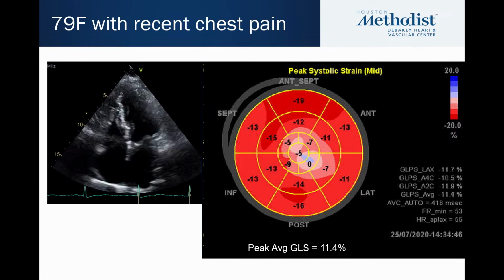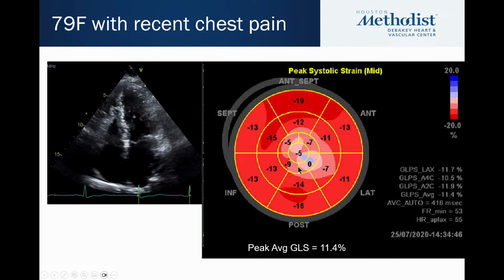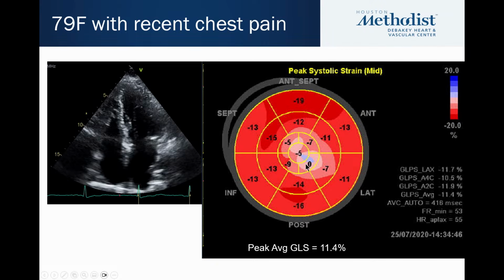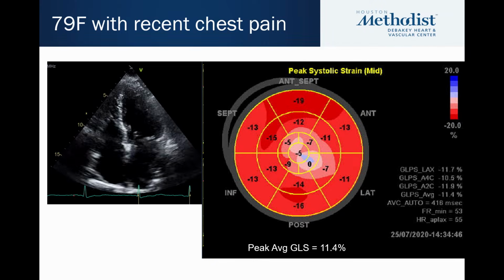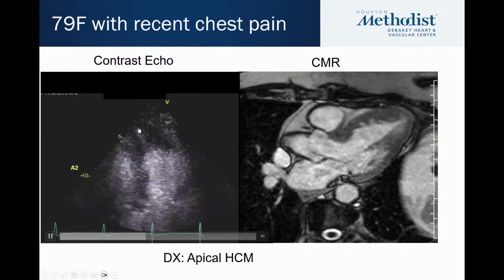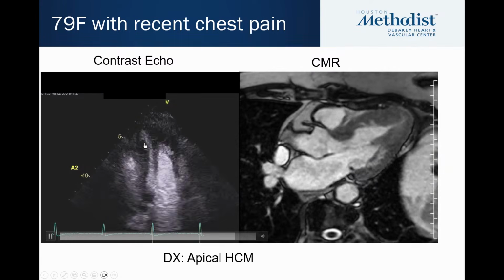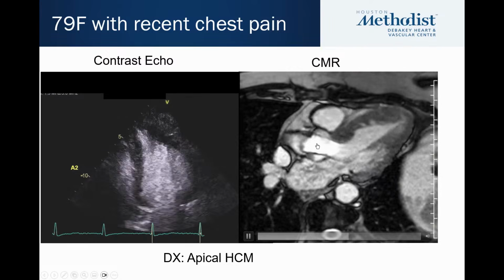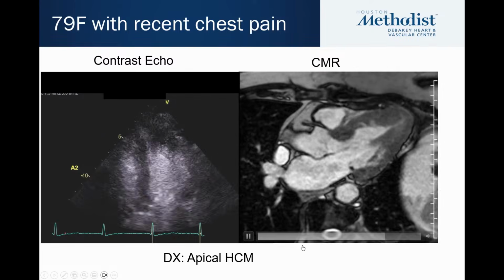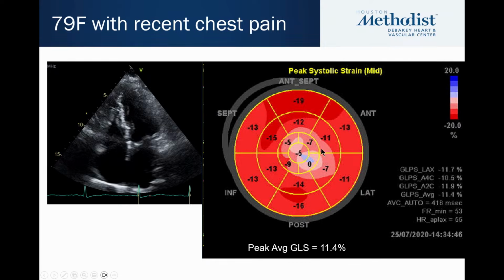And this is somebody that has what looks like a great heart, great looking heart, but again have this apical area. So could this be another ischemic myocardium? Maybe. But when contrast is given, clearly this is an HCM patient with the apical variance where you have obstruction of the apex with this cavity here with very high pressures and in fact a little bit of an apical infarct. And the strain picked it up very nicely.